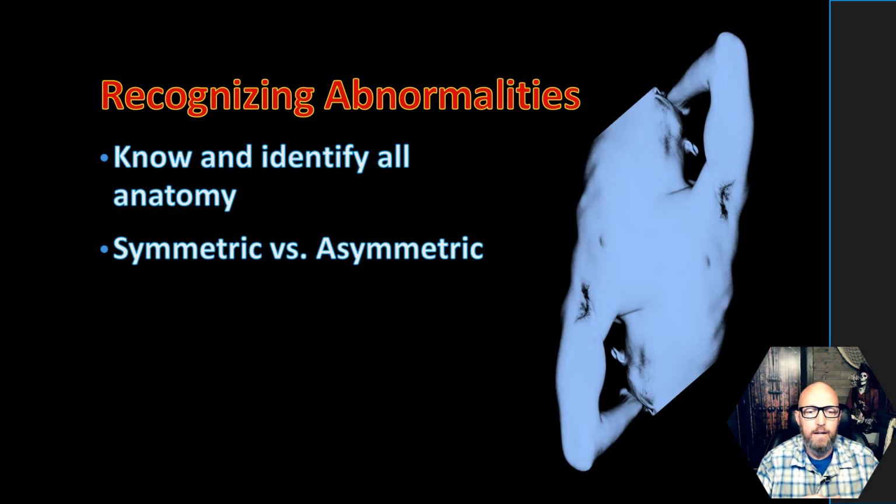So when do you see that? When you're looking at a panoramic radiograph, you should see relative symmetry. When you have a full mouth series of intraoral radiographs, look from one radiograph to the opposite side, and usually patients are pretty symmetric. It's sometimes surprising when someone has caries on one tooth. Not always, but a lot of times they'll have a carious lesion on the opposite tooth, so you look really closely on that other side. Same thing with periodontal disease and a lot of different diseases that we get.